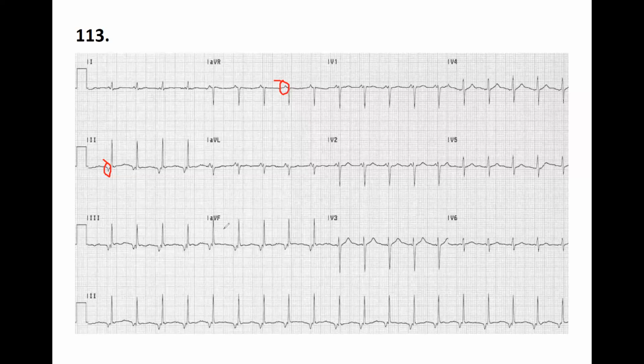And then I looked at lead 1. Lead 1 is positive, so the axis is on the left side. Then the AVR is negative, so it's normal deviation. AVF is also positive. Okay, lead 1 positive, AVR negative, no more. All right, that's it.